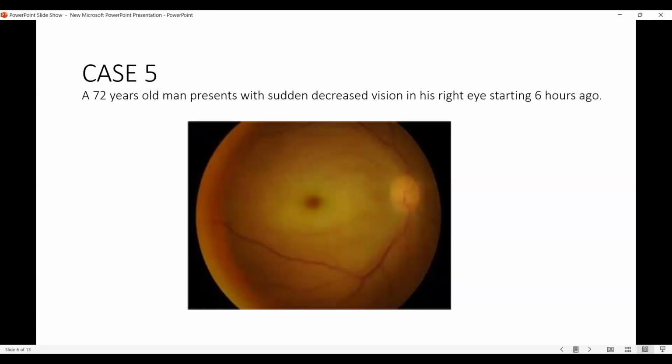I am not able to make out the margins clearly, sir. So that is why I am not very sure whether it is there. The resolution is not very great, but I think that the margins are a bit blurred. Margins, like there can be doubt or controversy regarding that.